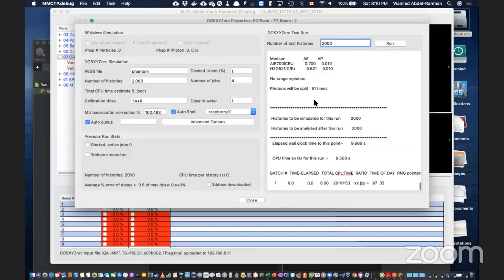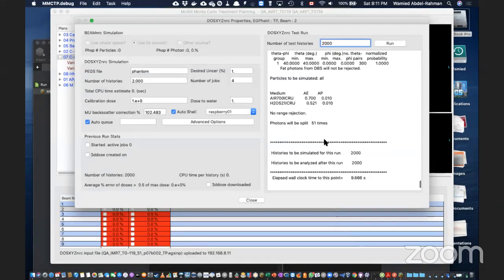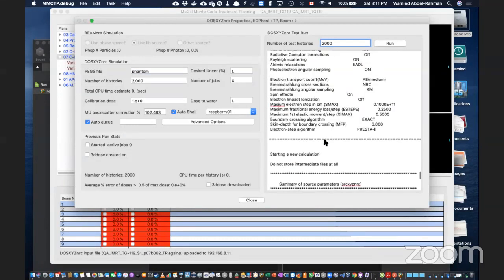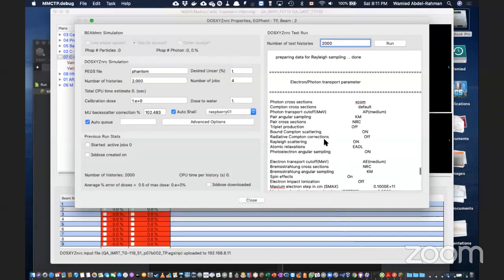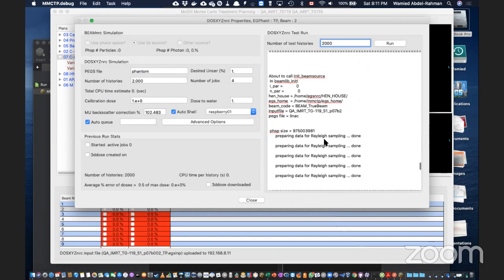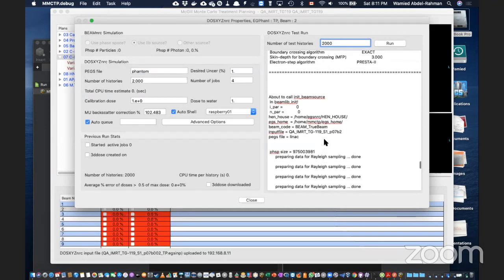Oh, okay, it ran actually. So there is no error there. That's fine. I thought there was going to be an error because an input file for the beam was not generated, but it seems it will automatically generate the input file, and that is fine.